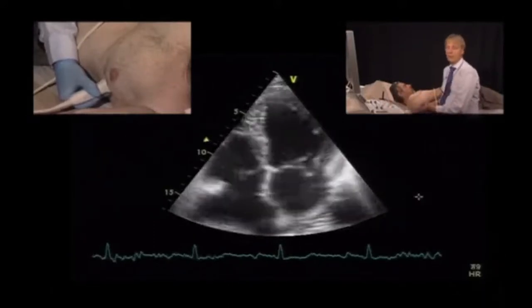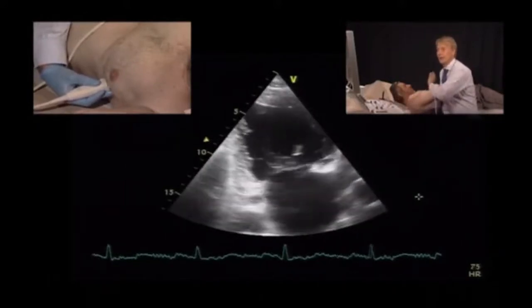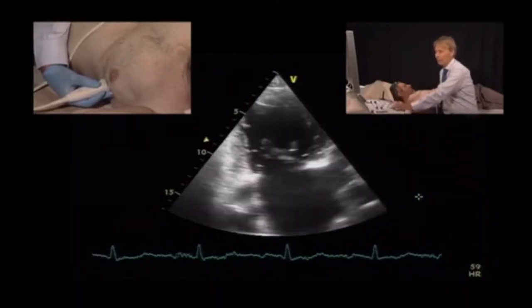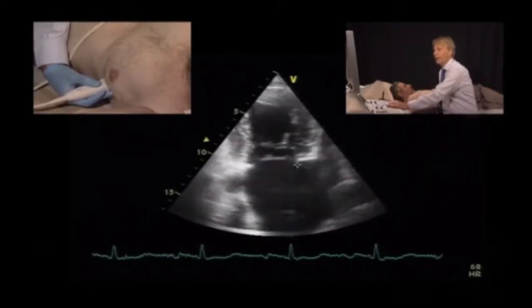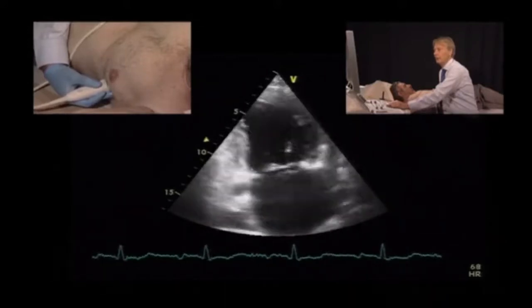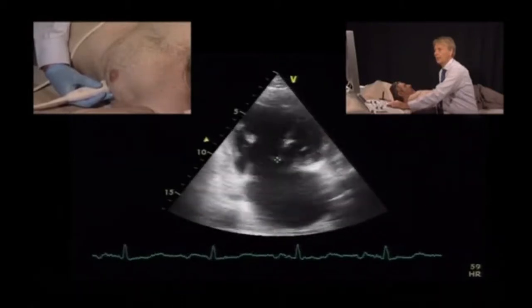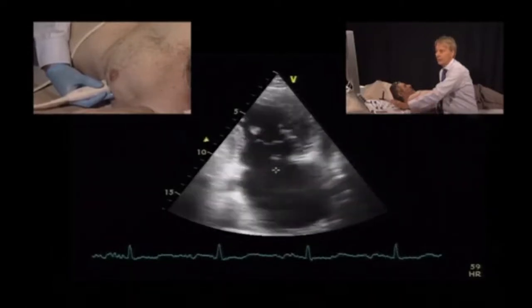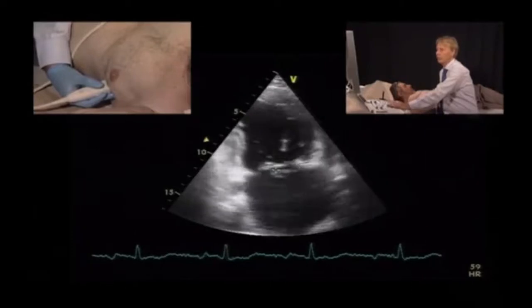You can also use other views, for example, the two-chamber view. This would be a two-chamber view where we cut along the commissural closing line, so you cannot really differentiate between the anterior and the posterior leaflet, but you can say exactly which portion of the valve you see. Here this would be the anterolateral commissure, and this the posteromedial commissure, and this in between would be the medial aspects of the valve. So looking at the morphology, you can see where the problem is located. Even though you cannot say if it's the anterior or the posterior leaflet, you can say if it's further anterolateral, medial, or posteromedial.